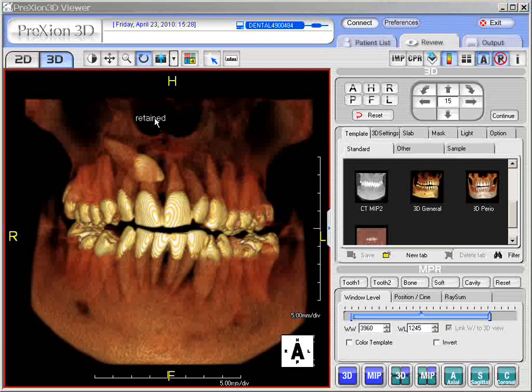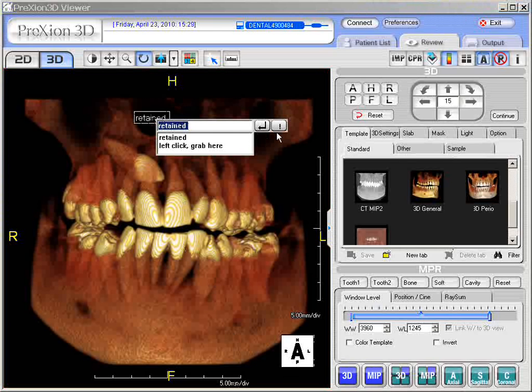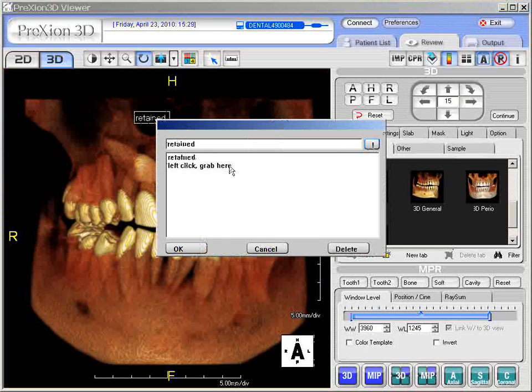when you click the term itself, you have an ability to edit. So here when you click the edit icon, you can pick on an area. Maybe you want to delete that. Or you can add in your favorite ones that you wish, and you can have your list, and instead of typing in, you can just simply click it and it'll be activated to the screen.